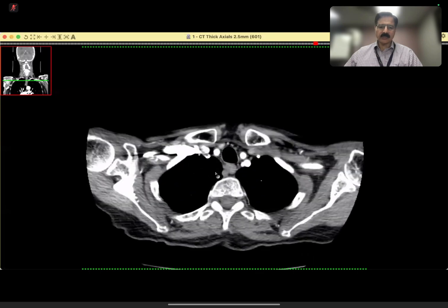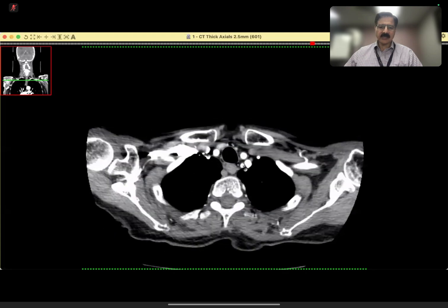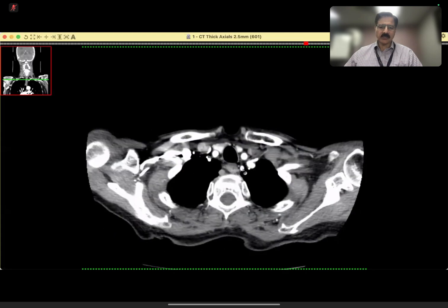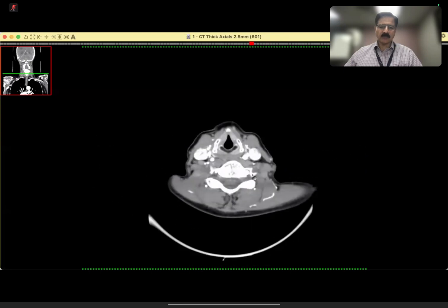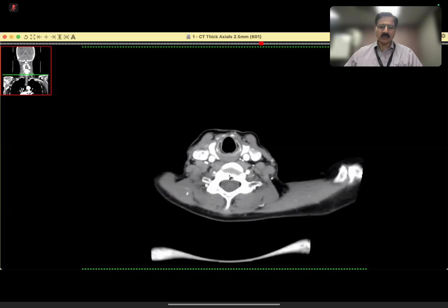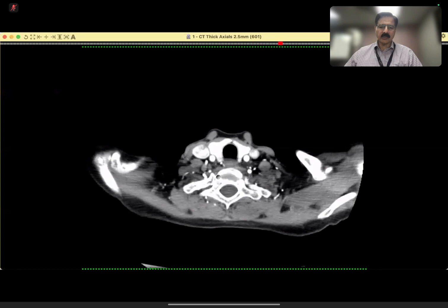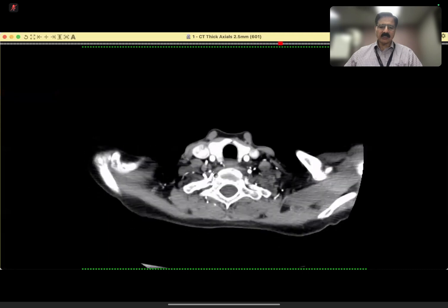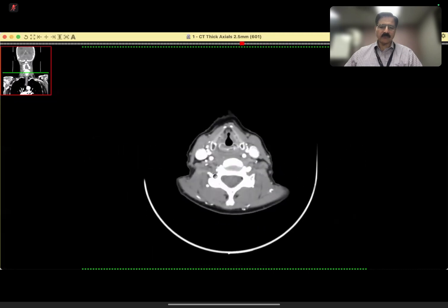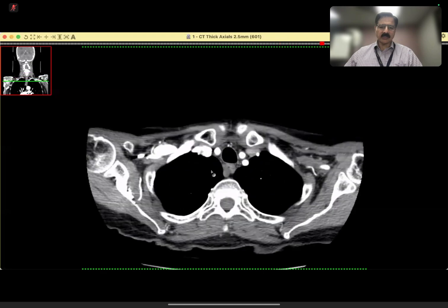And just to make a point, on the left side, this is the subclavian, and in comes a more chunky left-sided vertebral. And please remember, right and left vertebral can also be a normal variant. This one will be smaller as compared to the other. So don't overcall it. But in this case, this is the vertebral. And you can well imagine that this vertebral is causing the steal phenomena, and that is what it is.